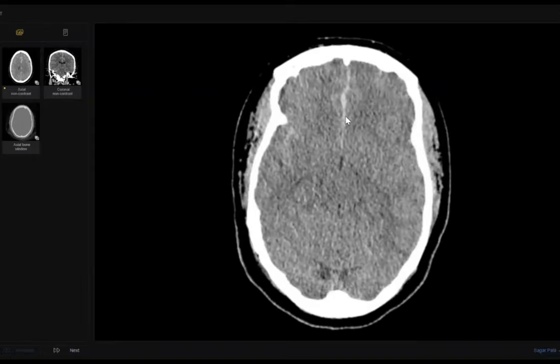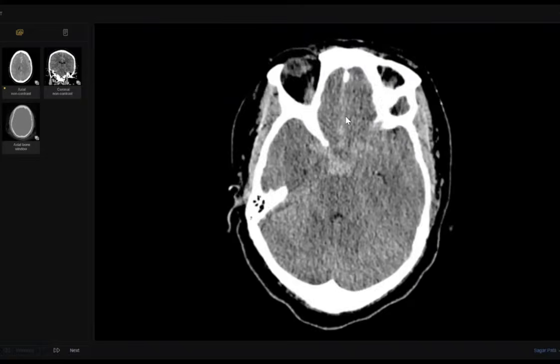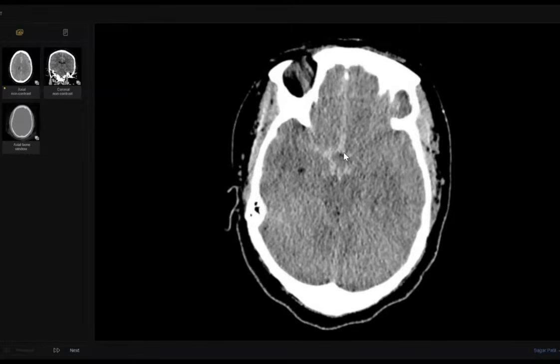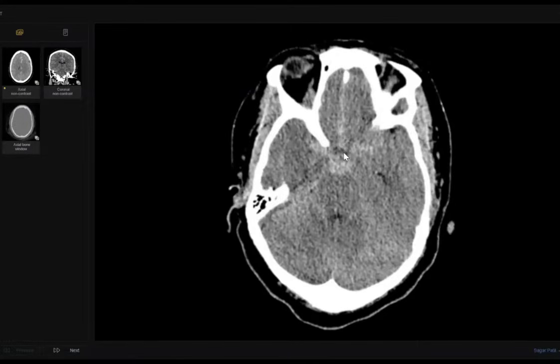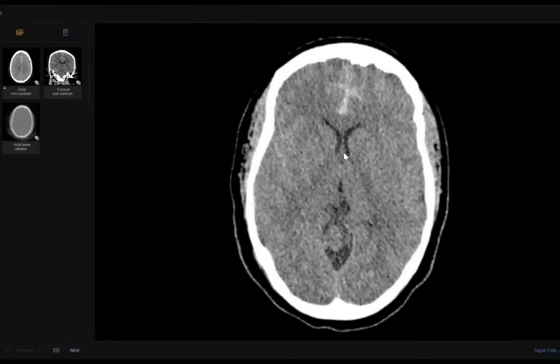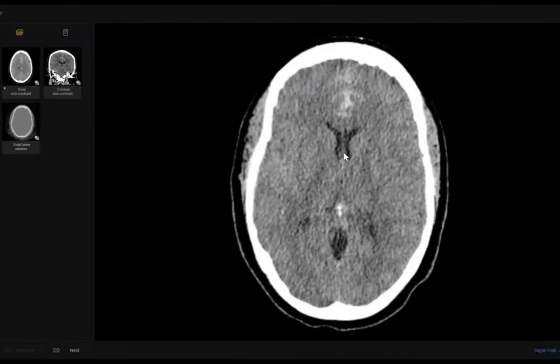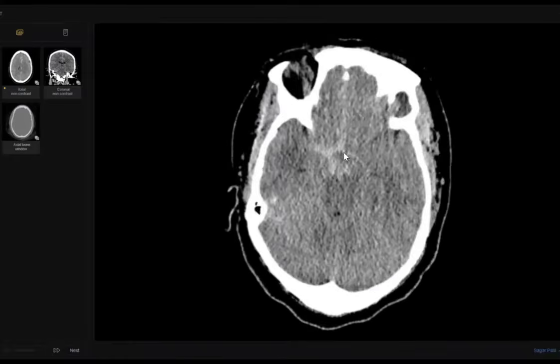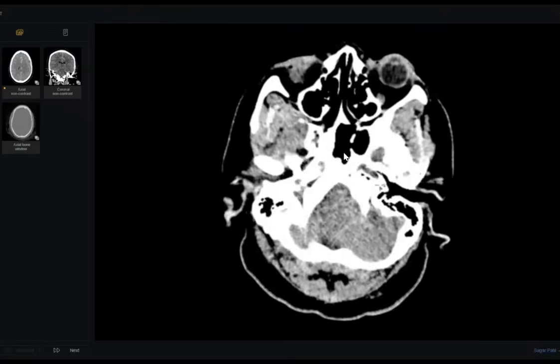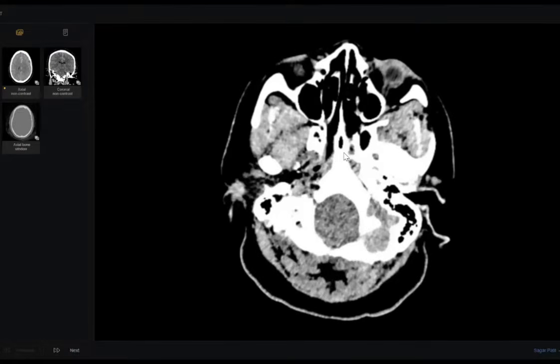If you look down here at the basal cistern and the circle of Willis, even in both Sylvian fissures, there is subarachnoid hemorrhage. You did very well, doctor, when you mentioned this is a surgical emergency. Why? Look here, my colleagues, at the foramen magnum level. This is the most important sign. This is the medulla and cord junction.